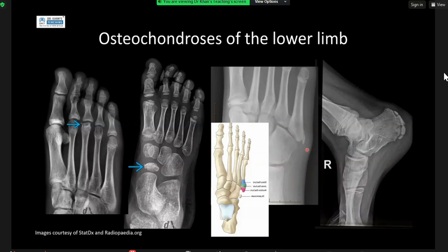So this one's a hard one, and things to look out for are whether you've got soft tissue swelling, and whether the patient is asymptomatic, because this could also be a normal apophysis site. Don't confuse that. Apophyses are always vertical, fractures are transverse lucencies. You've got stress fracture, Jones fracture, but essentially if there's a fracture there, you call it a transverse lucency.